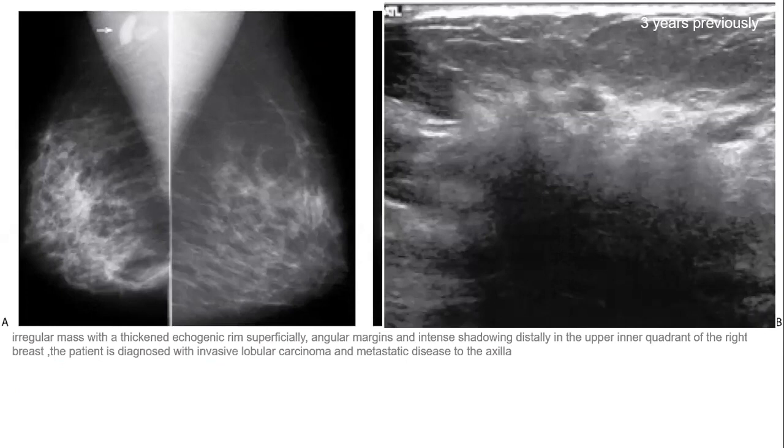Sclerotic type cancer. Lobular carcinoma. Yes, it is commonly seen with lobular carcinoma, though the common presentation of lobular is focal disease, not the diffuse shrunken breast. But when you see a diffuse infiltrative breast with shrinkage, think about lobular carcinoma as a common cause. But lobular itself does not commonly present in that way.